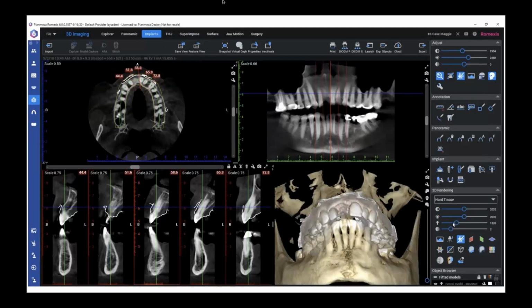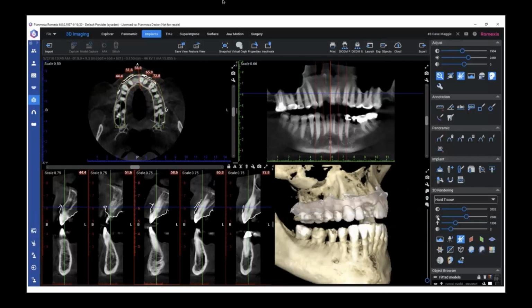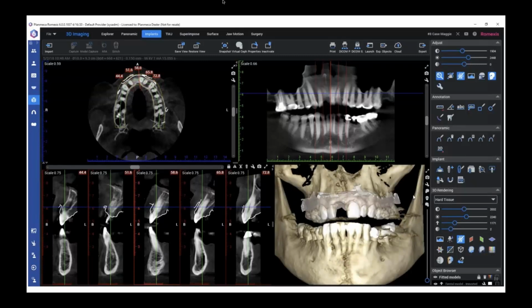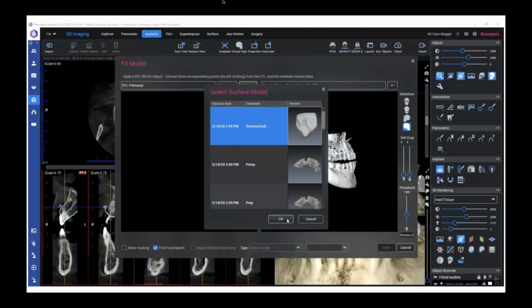So we have our intraoral scan. The final thing we need to do is bring in the wax up. Within this same software system, within the patient's same file, the process is really easy. All you have to do is go through and import that in, but instead of having to physically merge it, it's going to use the positional data from your wax up.